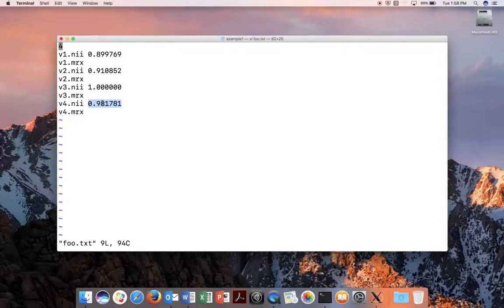But anyhow, this file is meant to be inputted to other programs. So for example, the Kaiba program or Yuki program in the automatic registration toolbox will directly read this file and will be able to work on registered and scaled images.